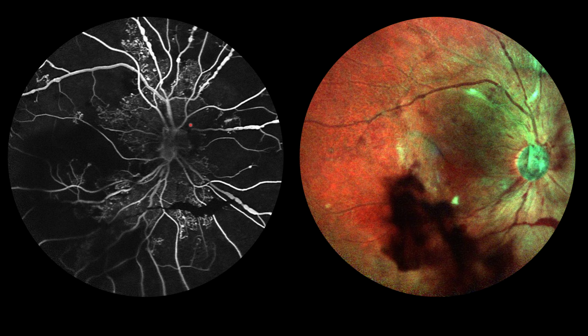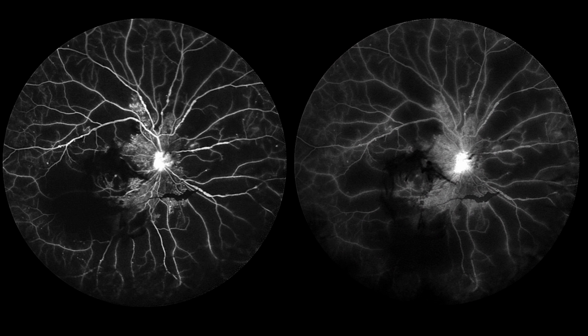And then of course we have to think that if there is so much ischemia, whether there is any new blood vessel also, because we can see blood, so there has to be some new blood vessel somewhere which is probably bleeding. Now here we can see there are some abnormal blood vessels, but we are not sure from where exactly the bleeding is occurring. For that we have to look at later images to see which of the blood vessels are leaking, because a normal blood vessel doesn't leak, and if a blood vessel is leaking, it's an abnormal blood vessel.